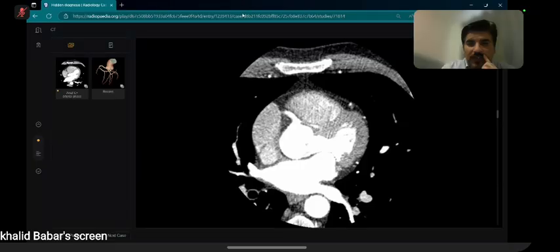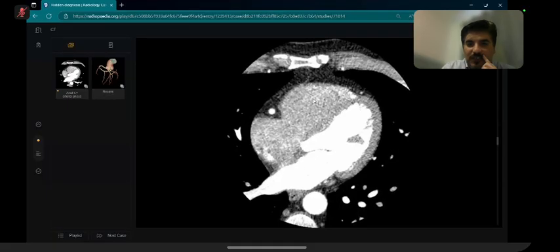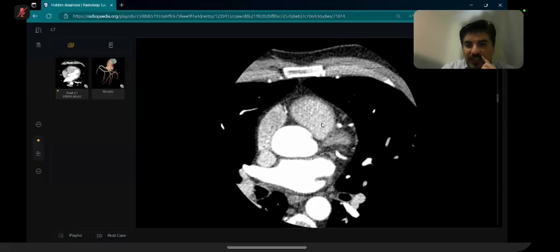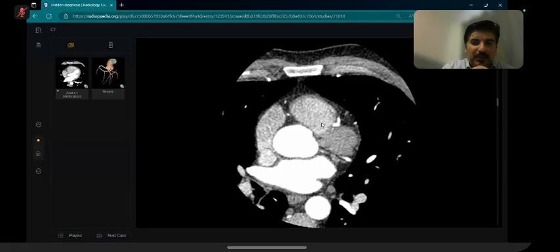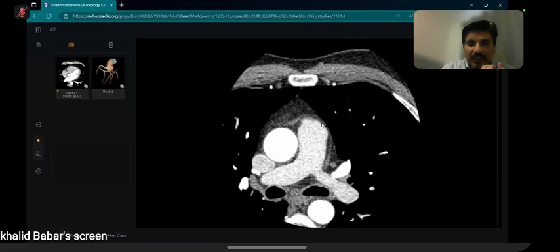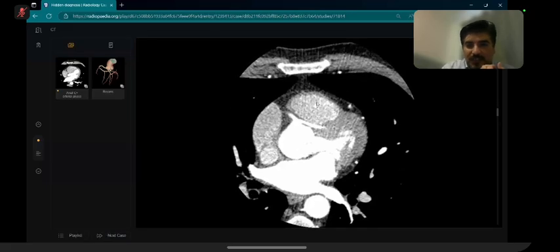Okay, so here again, you see the right ventricle when it goes and forms the pulmonary trunk, there is a right ventricular outflow tract, which is here, which is also again a pulsatile structure, because it forms the pulmonary artery superiorly. So if the coronary arteries are coursing between the right ventricular outflow tract and the aortic root or aorta, they are still called the malignant origin.